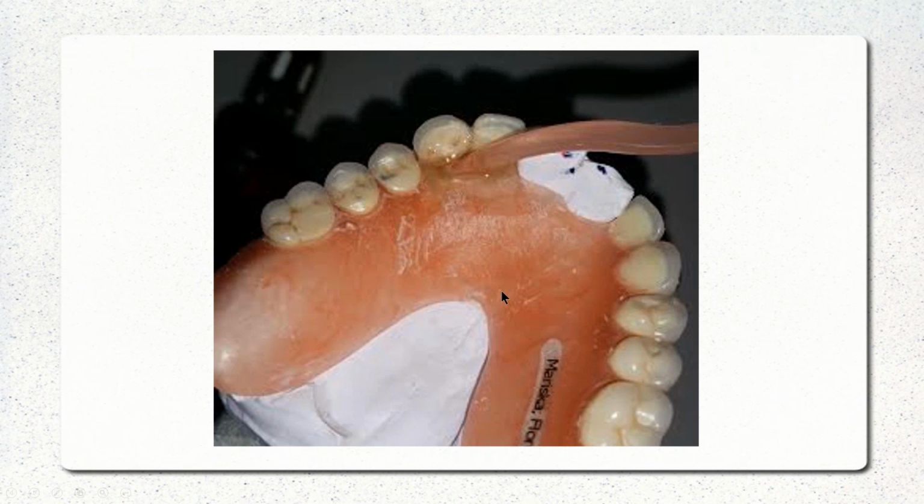And so the Hotshot gun really is a nice piece of equipment to have in combination with this, because it basically saves hours and hours of time because you don't have to start over again. A lot of times it can be an easy repair, and it's just as good as brand new. It's not a weaker material. It's not something that's going to stain worse. It is just as good as brand new.